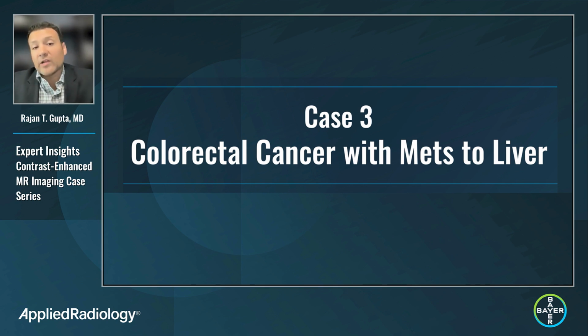Okay, and then we're going to move to our final case, case 3, where we're going to talk about colorectal cancer, metastatic disease to the liver. This patient is a young patient who was newly diagnosed with colorectal cancer, and they had metastatic disease in their liver.